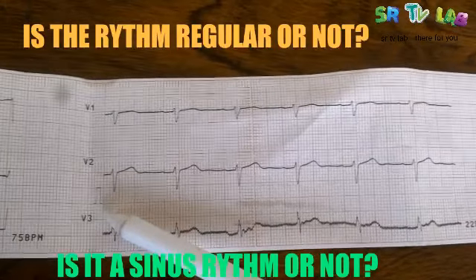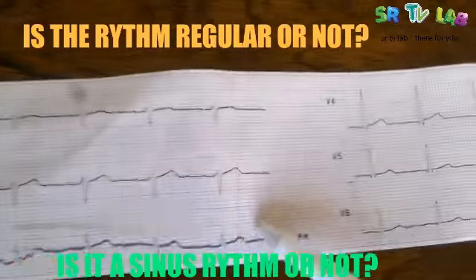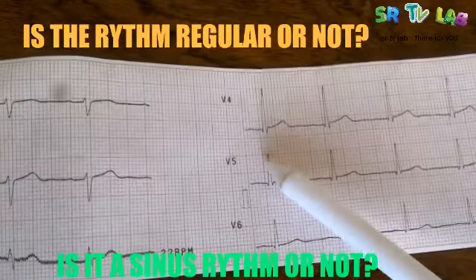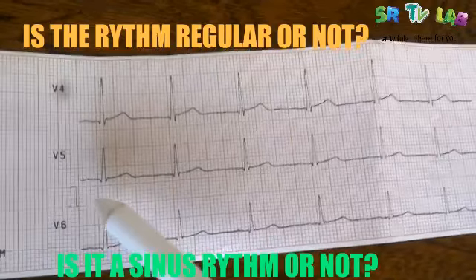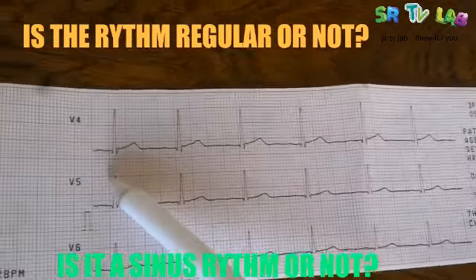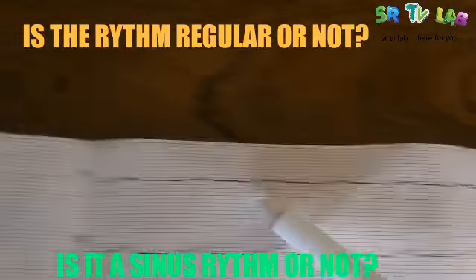Remember, how many chest or precordial leads are there? 6 of them. Then we go to V4, V5, and V6. This is how the electrocardiogram looks.